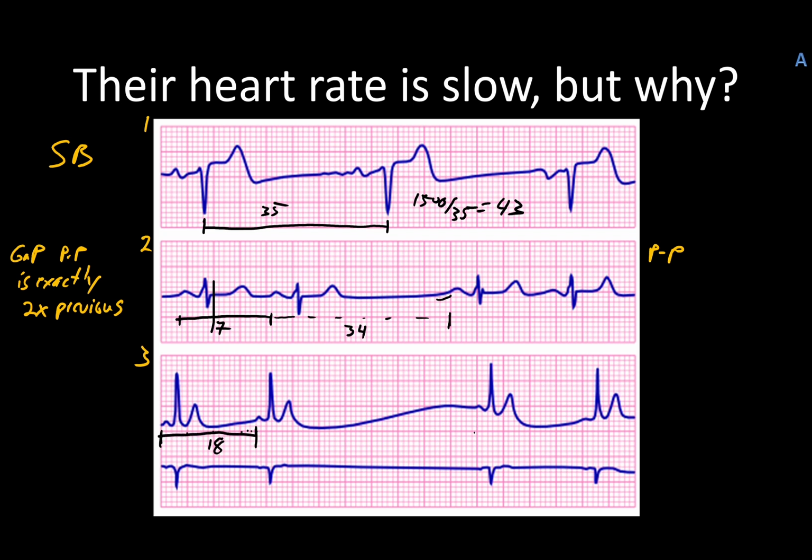And this one way out here stops about right there, and that is 5, 10, 15, 20, 25, 30, 35, 36, 37, 38, 39, 40, 41, which is well over double, because 18 times 2 is 36.